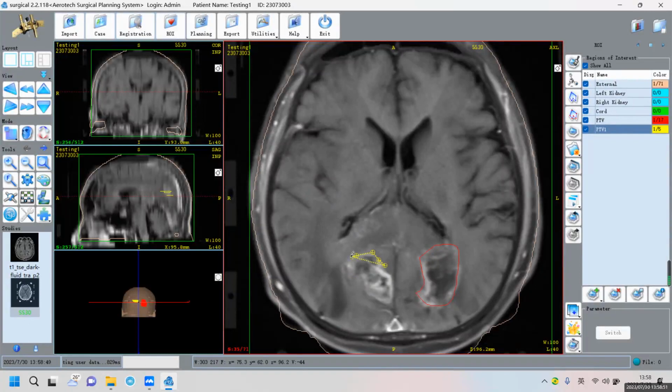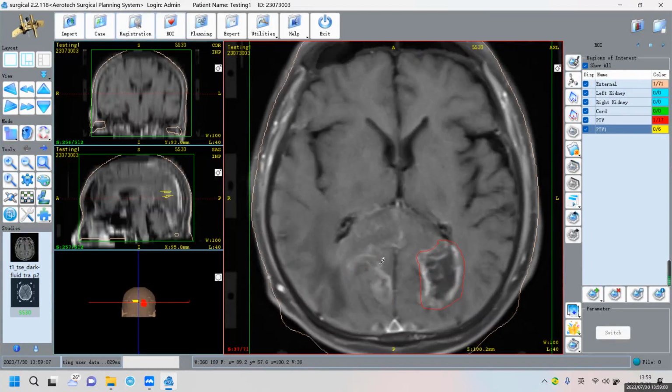When you're doing surgery, do not do like me, because I just wanted to save time. So use the freehand and clearly mark it out. When you do surgery, you should mark the focus area as much as you can.